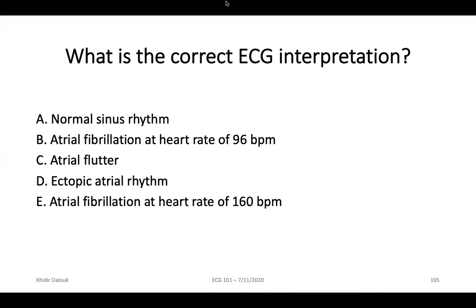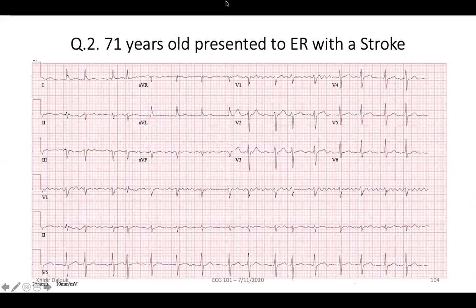Any answers, Mazin? We're just waiting for a minute. So I have the first answer coming out as A flutter. A flutter. Okay.